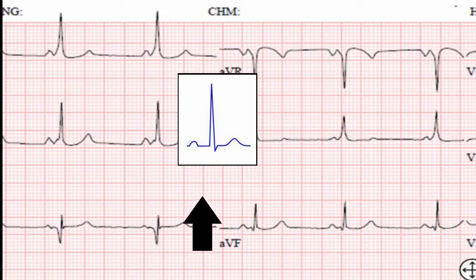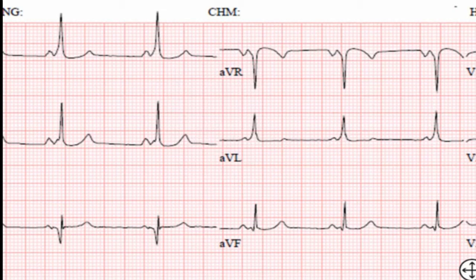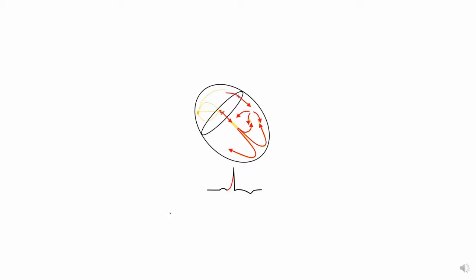So you usually see an isoelectric interval. If you don't have any artifacts on the ECG, you expect to see an isoelectric interval between the P wave and the QRS, which is most of the delay that's happening in the AV node. Here you don't see that. It seems like the ventricle wants to start activating right after the P wave, and then you have to wonder, well, is there any connection between the atrium and the ventricle that bypasses the AV node? And that pattern is called pre-excitation, which means that you're exciting the ventricle before you can excite it through the normal AV node.